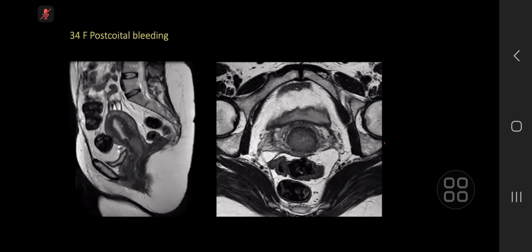Okay, so on the selected T2 sagittal and I think axial images, there is an abnormality centered around the cervix where there is an intermediate signal mass. This is, I think, possibly invading superiorly into the uterine cavity. And on the axial image, there's an indistinct border posteriorly with maybe some stranding of that fat and extension to the rectal fascia.